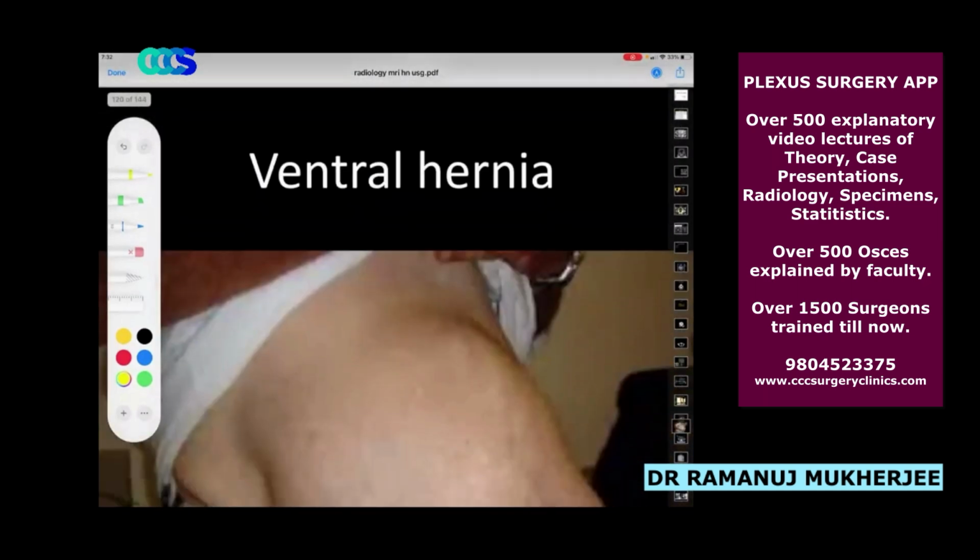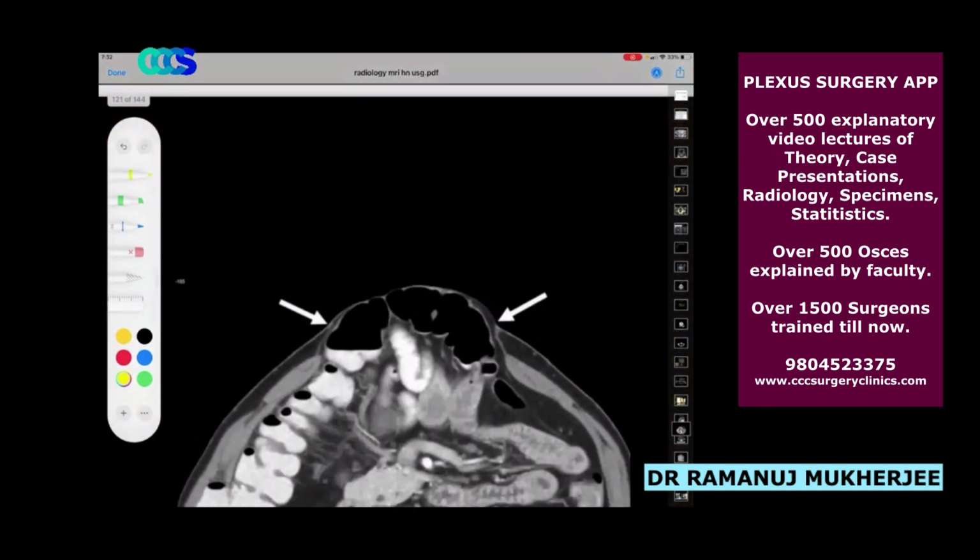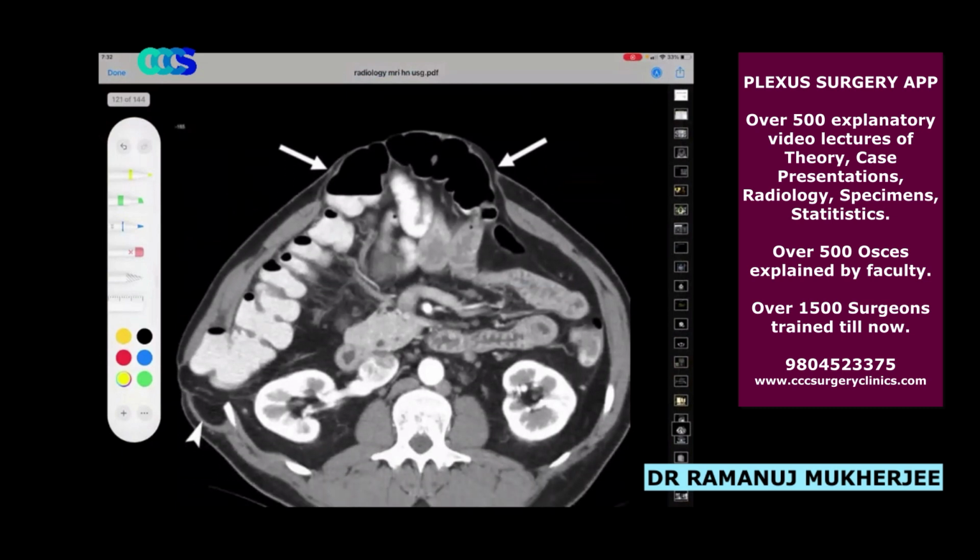Very good. Now, talking about ventral hernias, the reason that we should do a CT. Ventral hernia number 1.